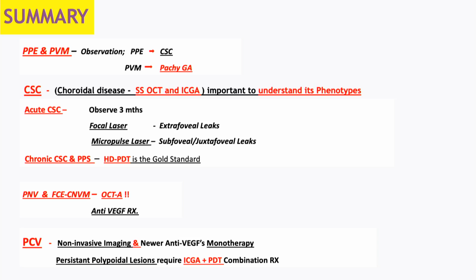Pachy neovasculopathy, secondary CNVM and FCE related CNVM, OCTA is very important because conventional angiography sometimes may miss it. And PCV, there are non-invasive imaging criteria now, anti-VEGF monotherapy, and ICG and PDT reserved for persistent polypoidal lesions. Thank you.